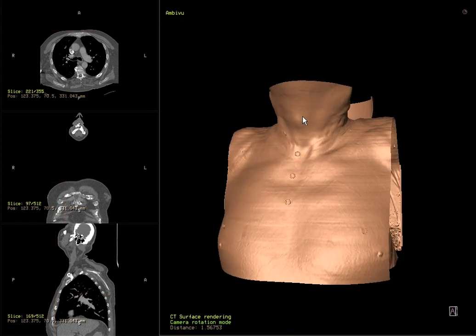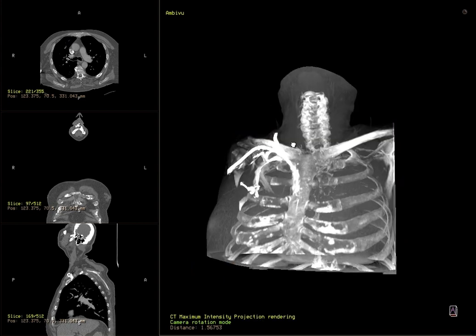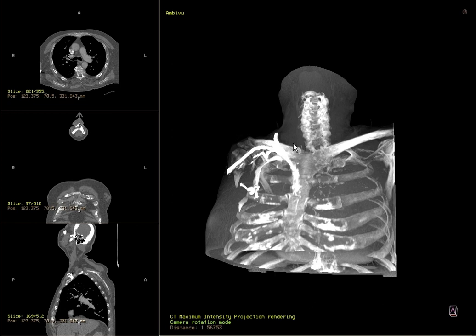Thick slice reconstruction is another feature. We select MIP. We can move through the volume and render in any volume rendering mode a thick slice that corresponds to the position and orientation of the currently selected grid item.